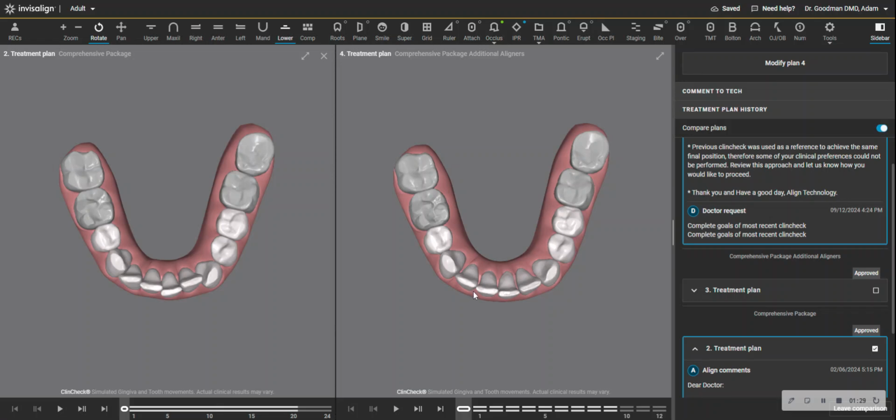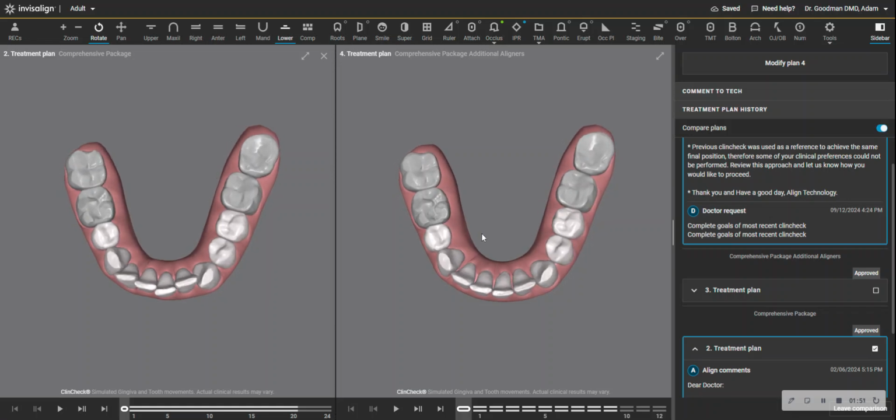And you could even maybe consider it overcorrection. Not necessarily that you have to move it out so that it's actually buccal, but this is almost passable. In other words, if this was all lined up, I might leave this, but I know it's going to have a tendency to go back towards that. And so I want to nail it. So in other words, my overcorrection could be just nailing it, but I wouldn't have known that had I not seen this. Similarly, another great example.